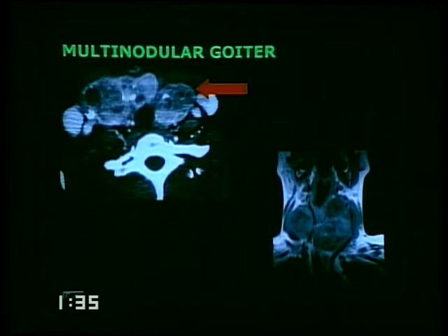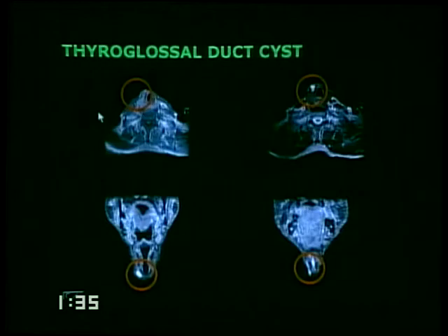Multinodular goiter, these multiple nodules have various texture, differing architectures, liquid and necrotic change, calcifications, infiltrates the fat around it, looks very, very aggressive and biologically malignant. It's not. Thyroglossal duct cysts sometimes may have a solid component associated with them. Duct cysts are simply remnants of the thyroid gubernaculum. It was arrested on its way.